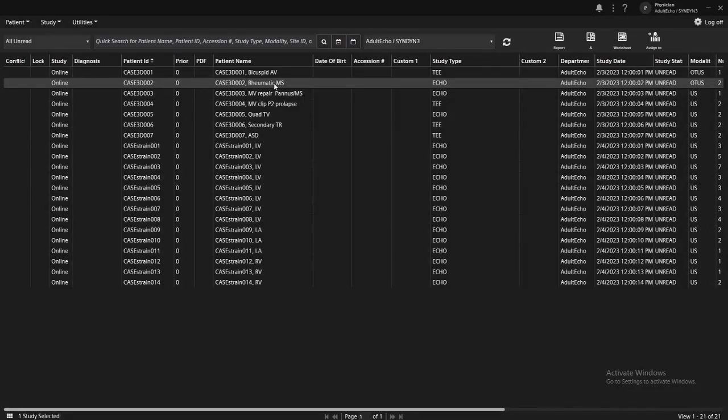And so we're going to be spending a little bit of time this afternoon just using some software on the laptops to do some 3D cropping, reconstructions, measurements, things like that we're able to do offline.